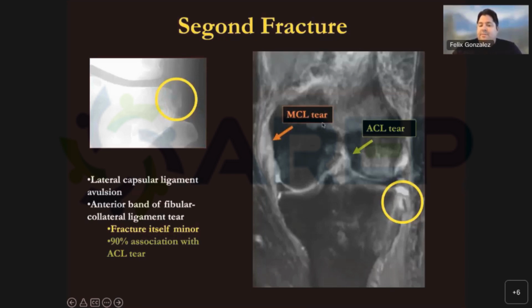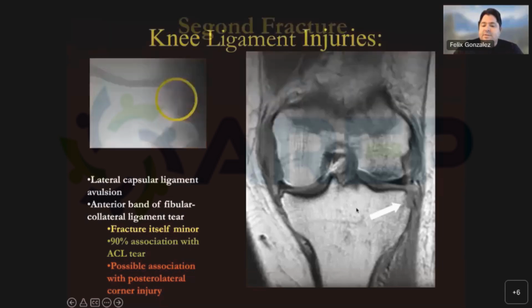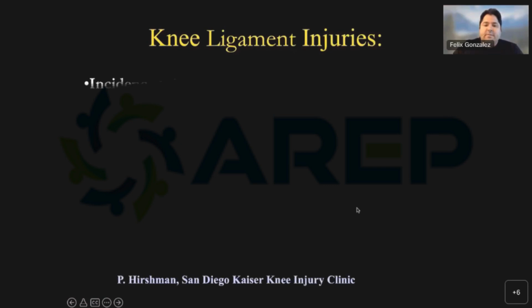This patient also happened to have a proximal MCL tear on the MRI that he had done. So here's the T1. You can see basically edema, right? And you just add some more information to that injury. Here's his complete dissociation of the proximal MCL with hemorrhage in that region, and the Segond avulsive fracture. All right, so moving on.